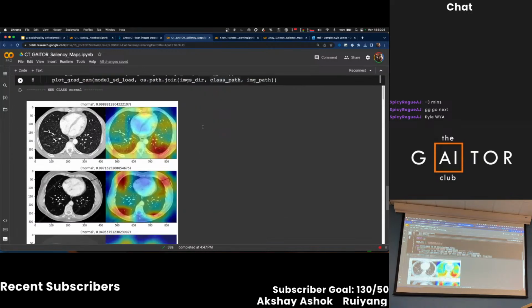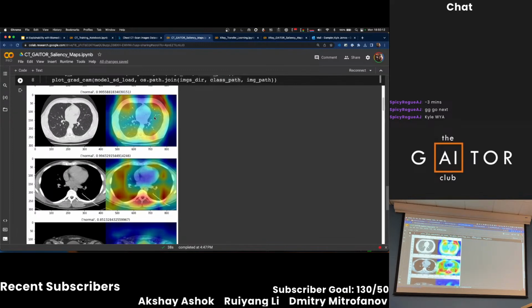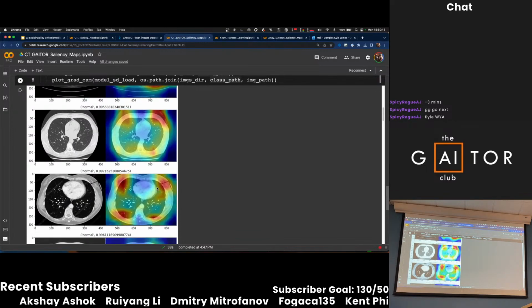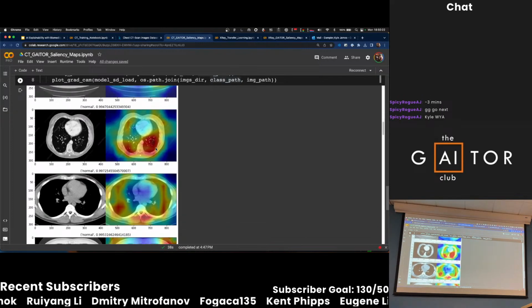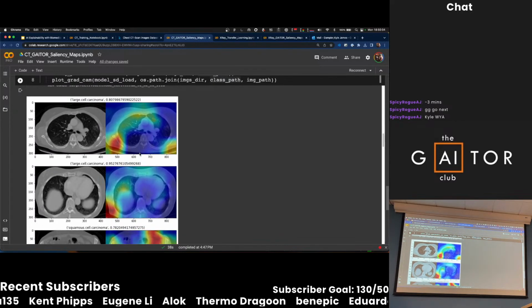Yeah, okay, so now you can see what the results are on the testing set. So this one here, I don't know why it's doing that, but it's normal anyways, so you can see it's kind of weighting normal things on the outside-ish, inside-ish. You can see I picked and chose which one to use for my presentation. This is the one I probably ended up choosing. And then large cell.